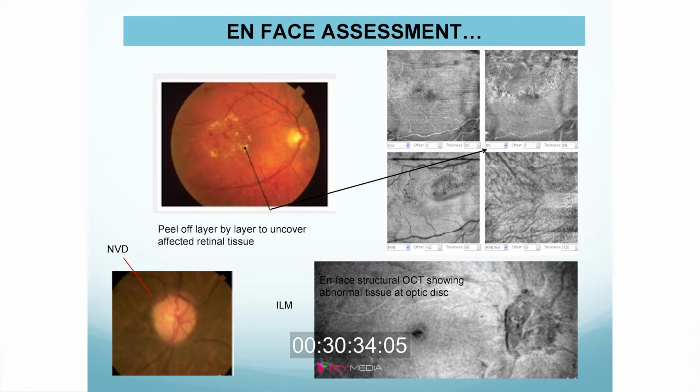Then we go down to the RPE. The RPE looks normal and the choroidal vasculature looks normal. So in this particular case, there was nothing else going on in the patient, but it substantiated where the area of damage was or was occurring.